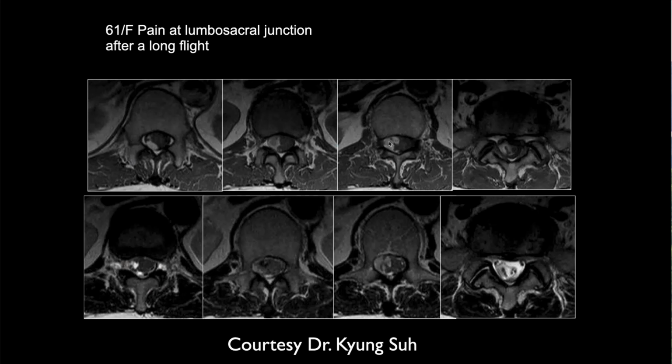Yeah, I just don't know how to really describe that. Increased signal on the right side of the, like, extradural, I think. So you think this is extradural? You think is it intra? Okay, let's think about that. Look at the way the nerve roots are clumped back here. And look at the configuration of this stuff. So this is a hemorrhage, right?